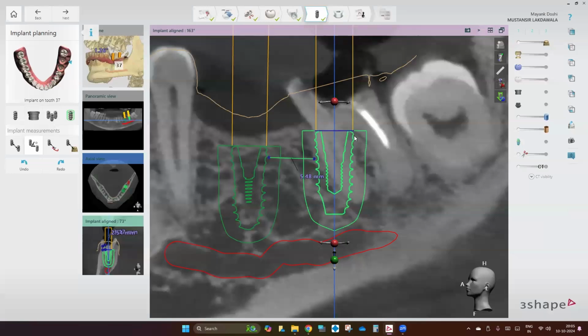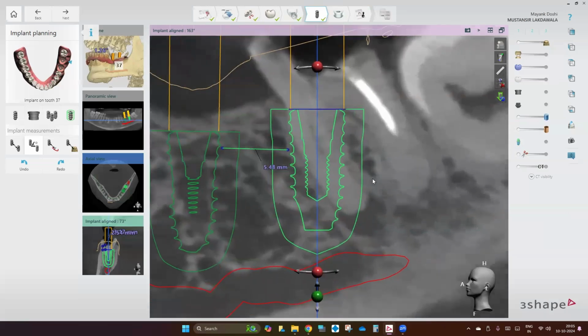There is no need to go and tap the patient's furcation, but I want you guys to appreciate a little better that this is the boundary of the furcation which is fully intact. Can you appreciate the furcation is fully intact? And the mesial wall, this is the patient's mesial wall. The implant is going to engage into the proper mesial wall, and the osteotomy is also going to be into the mesial wall.